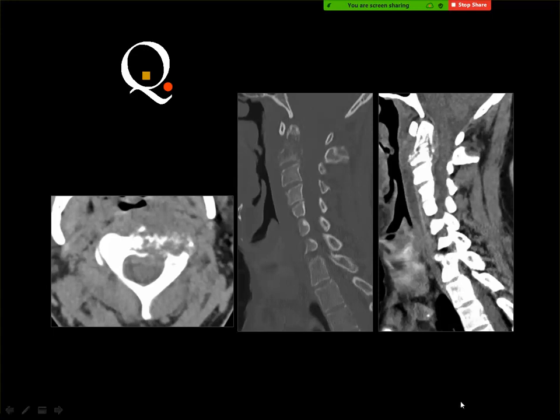Osteoblastoma? No, osteoblastoma is a benign lesion with a sclerotic margin and expanding appearance. But this is a destructive lesion in the odontoid process. Osteosarcoma, chondrosarcoma.